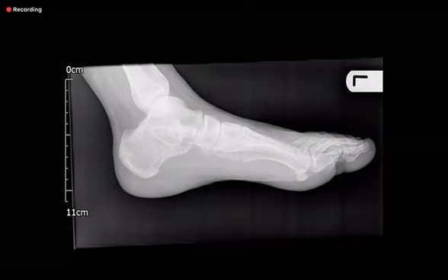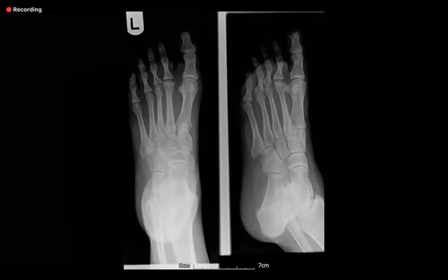Okay. So what are you going to do next? So this patient is symptomatic, and I will review the remaining images of this radiograph. And this patient will need a referral to the orthopedics team for assessment. Would you like to see another view? Yeah. Okay. So this is another view. Noting that the patient has got midfoot pain, on this view, I can see there is abnormality centered at the second toe metatarsal head with flattening of.